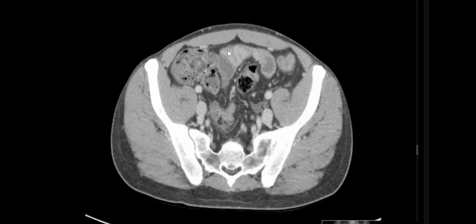So, terminal ileitis with hyper enhancement, bowel thickening and related comb sign with proximal dilatation. I may also be thinking of Crohn's disease, complicated by stricture and low-grade bowel obstruction. Very good. What else? With activity now because of the hyper enhancement and the comb sign. If this is Crohn's disease, I'd like to exclude other associations like other strictures and skip lesions.